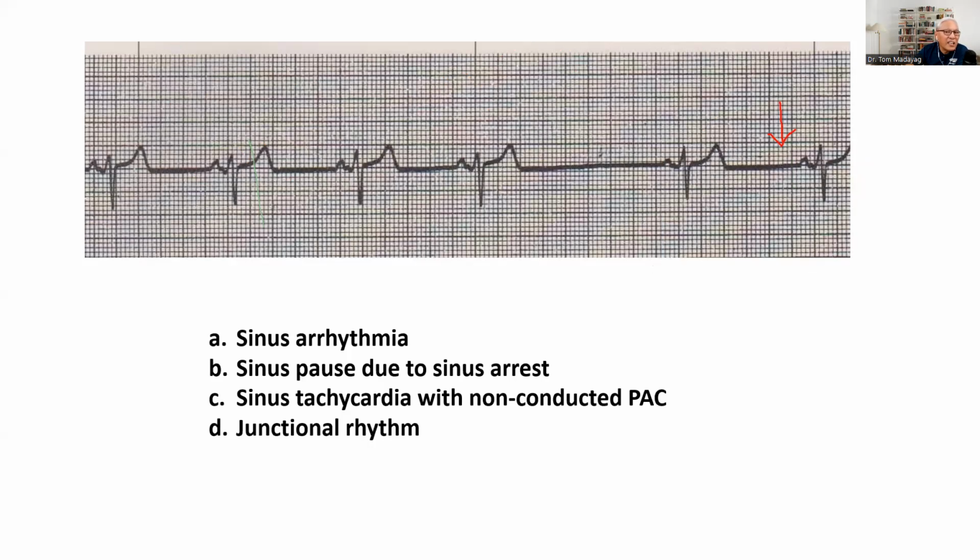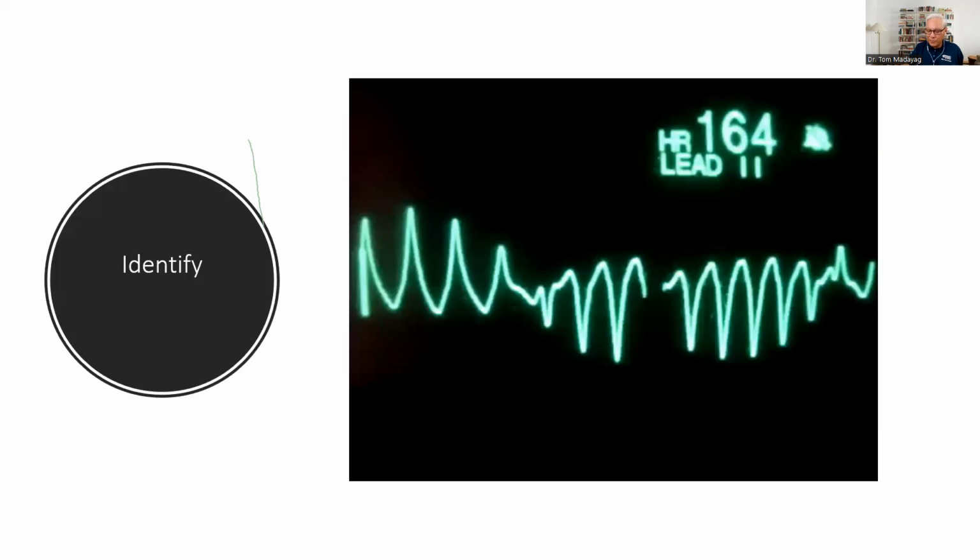And this is exactly what is demonstrated in this particular strip. All right, any questions? Great, let's go on and move forward.